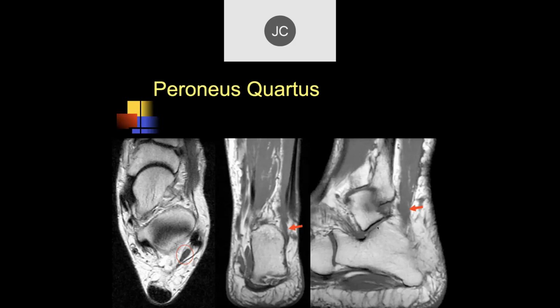So that's where it's located, and the accessory soleus would be on this side, the medial side.